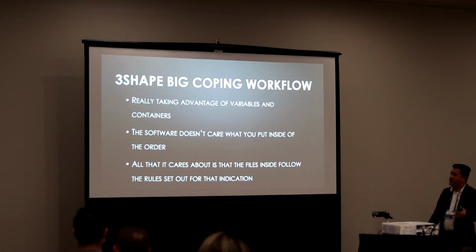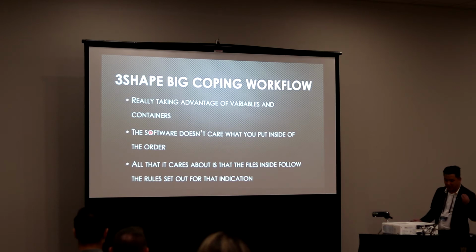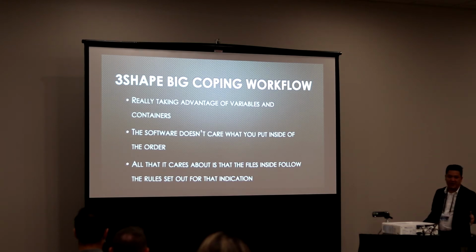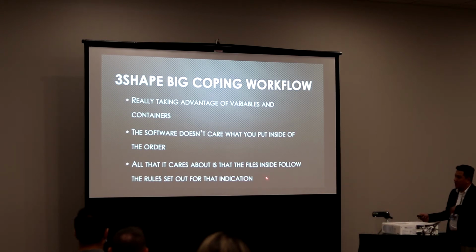Basically, we're really just taking advantage of, again, the containers and the variables. It doesn't matter that we're setting it up as a coping. The software just needs some information, and as long as we're providing that information to 3Shape, it'll let it pass. It's like a bouncer at a club, right? You give it a fake ID and he'll let you in. All that it cares about is the rules set for that indication.